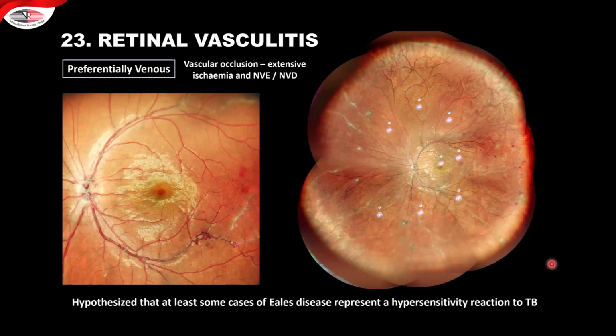Then there's retinal vasculitis, and at times Eales disease, when we can't find a cause, they cause sheathing and a lot of hemorrhages and exudation and capillary non-perfusion areas at times, eventually leading to tractional detachments, hemorrhages, and a lot of visual loss for these patients.